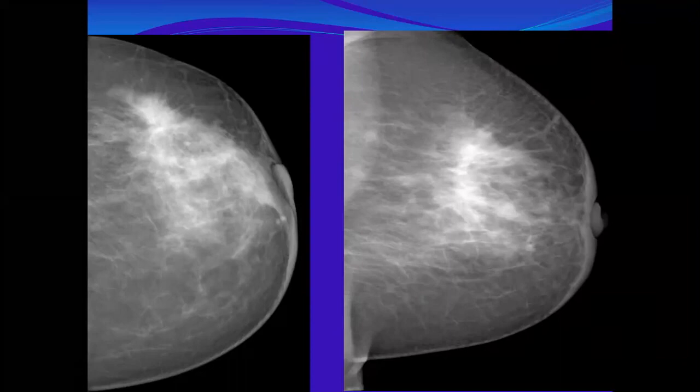When the breast is edematous, we expect to have a problem in the positioning, because the patient will resist the compression and positioning. So, demonstrate asymmetry at the lateral part of the breast with associated architectural distortion and skin thickening, nipple retraction.